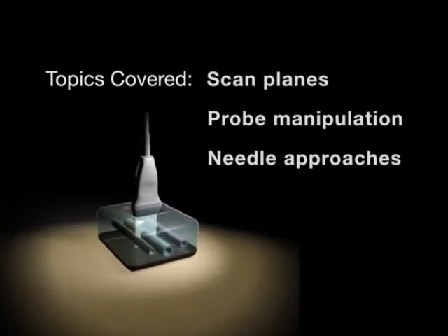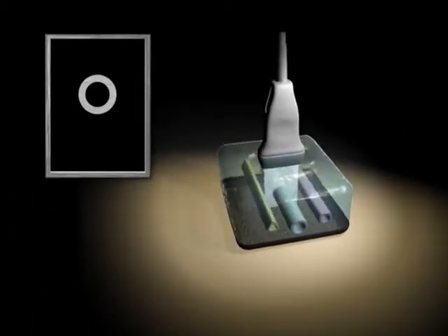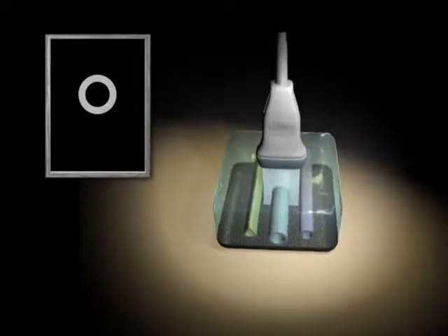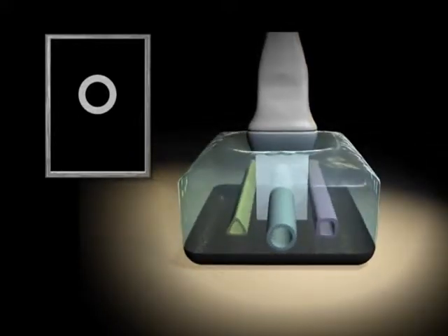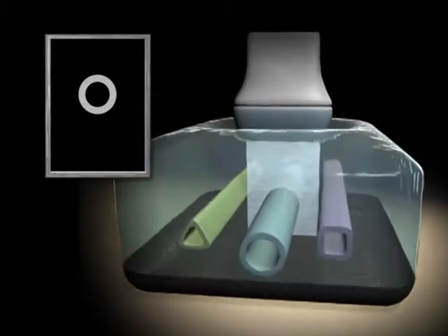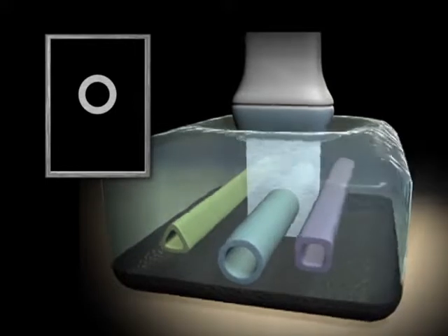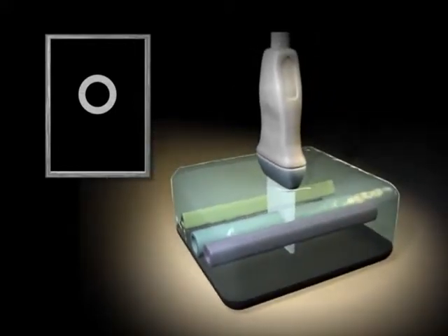In the following figures, we are looking at a schematic of an ultrasound transducer applied to a tissue-equivalent phantom with 3 different embedded objects. A depiction of the ultrasound screen is inset. We generally image long cylindrical structures with an ultrasound beam that is essentially planar. Short-axis imaging cuts this cylinder transversely, revealing a circle. Long-axis imaging cuts the cylinder longitudinally to create 2 parallel lines.